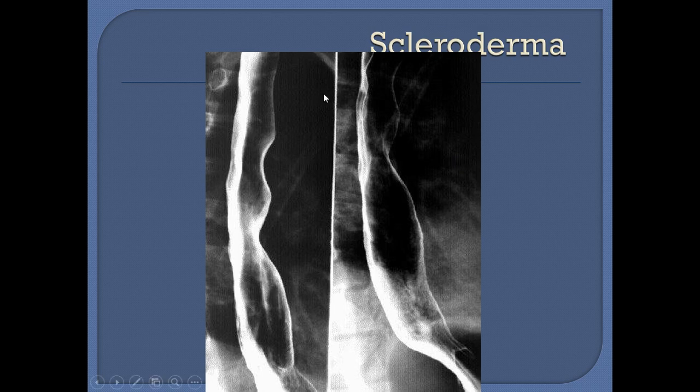This is the barium swallow examination. We can see the dilated esophagus with irregular aperistaltic motion, however no ulceration is seen. The transit time is delayed. It is a case of scleroderma.